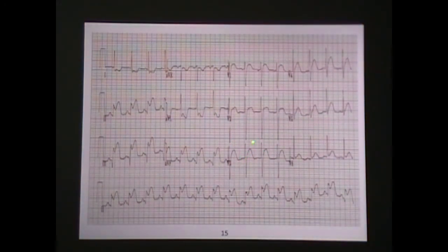It's hard to find a J point on here, where I would call that a J point if that's just a deep S wave. That's a difficult one. But remember, reciprocal changes for inferior right here. Boom. You got it. It's an inferior. Roll with it. Do a right-sided V4 and treat accordingly. If I had more time in this picture, I'd look at the P wave, my QRS complex, my QT, those kinds of things, but this is what's popping out for treatment for me.